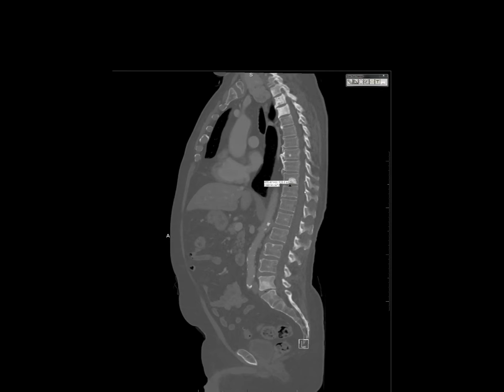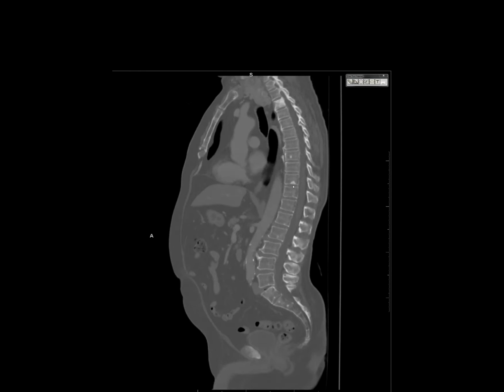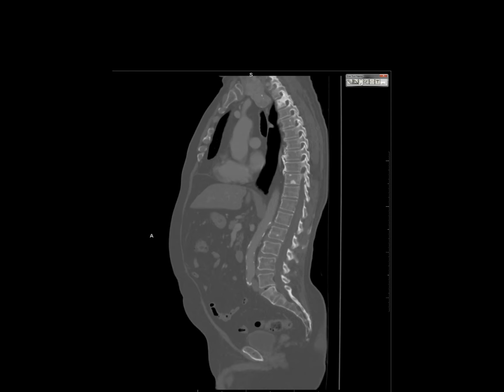And if you look here, the Hounsfield unit is 955, and so that's over that 885 threshold. But again, that threshold does not hold true when it comes to treated malignancies, as these lesions are going to get bigger in size and increase in attenuation after therapy.